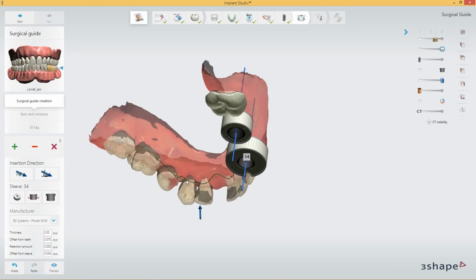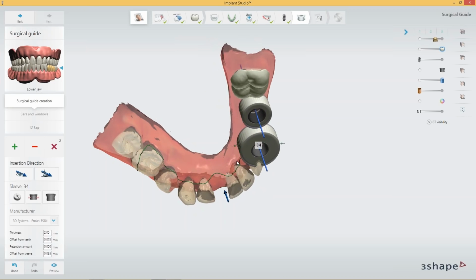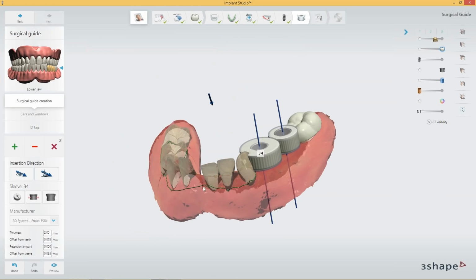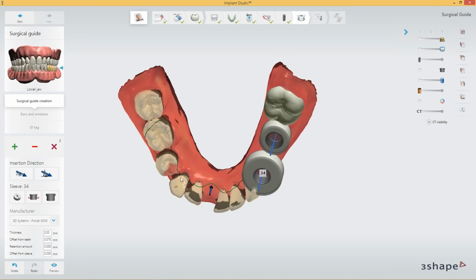This is just like placing the margin line, or cleaning up a model before Model Builder, or doing it in Ortho software as well. So you recognize this from all our softwares. Good. Now I'll turn it up again. Now it looks better. A little bit here going in between, so let's fix this.